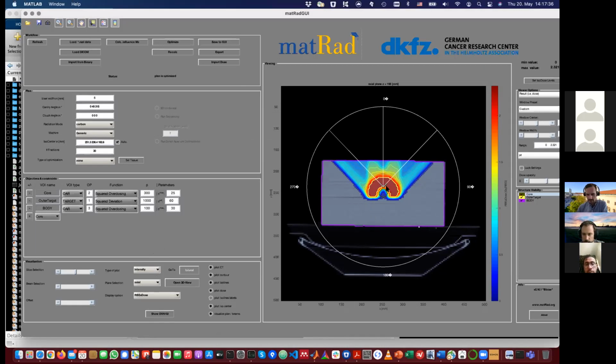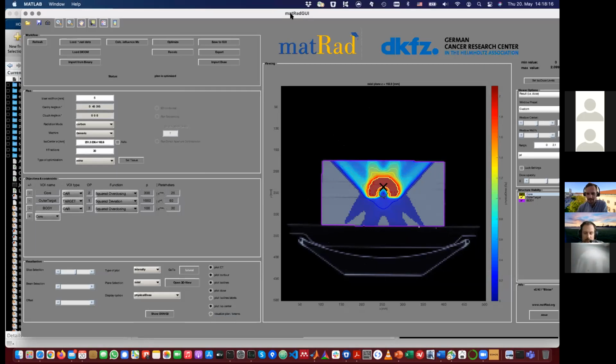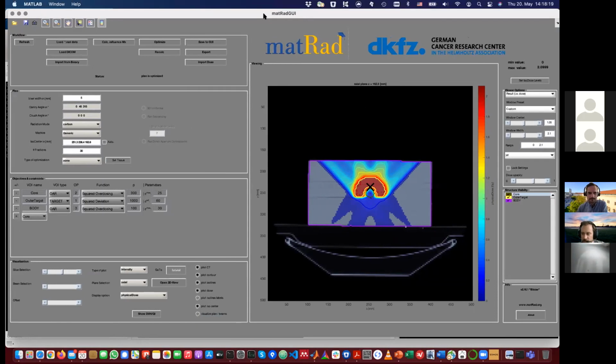All right, and now it should update the view. But just look at the proton dose distribution, and very soon the carbon ion dose distribution should appear. Yeah, all right, so there it is. It took quite some time to display, honestly, but now we see the physical carbon ion dose, and I guess you can directly see immediately what's different now to the proton distribution. So first, we have a dose distal to our target because of the dose tail, and you see also basically these are extensions of the individual beam directions.